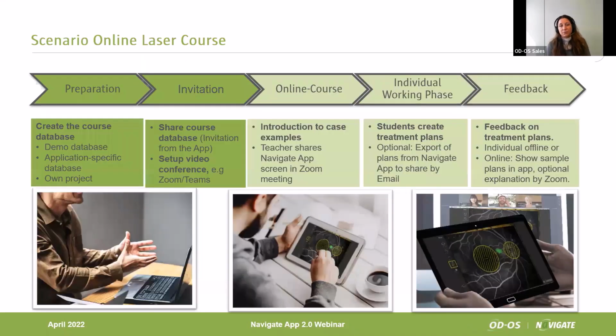So these are the last points. The course itself, you can create it as you like. In the first portion of the Zoom meeting, an introduction to the cases. Normally the teacher shares the screen. Then you have an individual working phase. That could be breakout rooms in a Zoom meeting, or the students just work offline and export their plans, send them to you for review or even a rating. And then you have the feedback phase, where again the teacher shares the screen, explains and shows a sample plan in the app via Zoom.